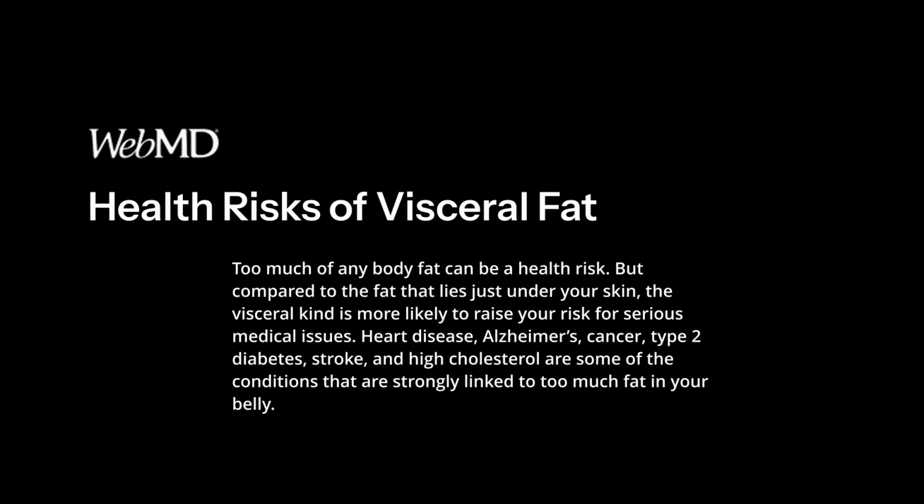Other than this, a very important parameter is the visceral fat level. Visceral fat is the most dangerous kind of fat which is around our organs. So, in case somebody's visceral fat is getting accumulated, the threshold for visceral fat is 10. And if the threshold is crossed, so if the visceral fat is more than 10, then it is an alarming state and the person has to take measures to reduce this visceral fat.